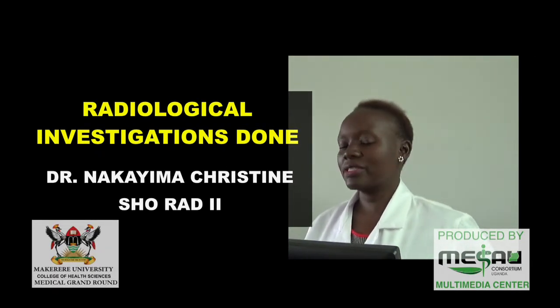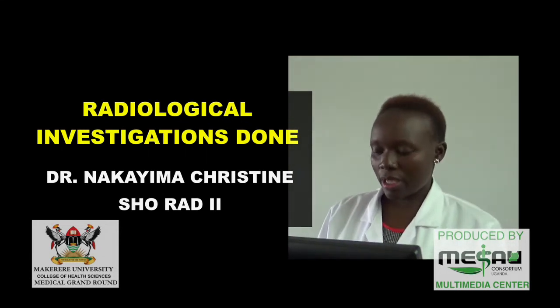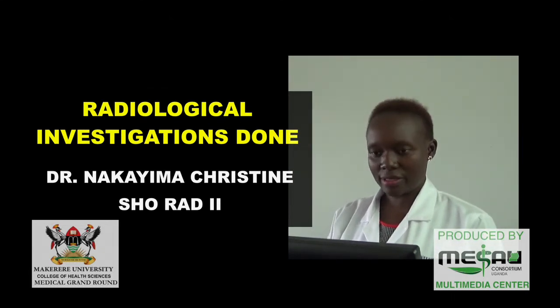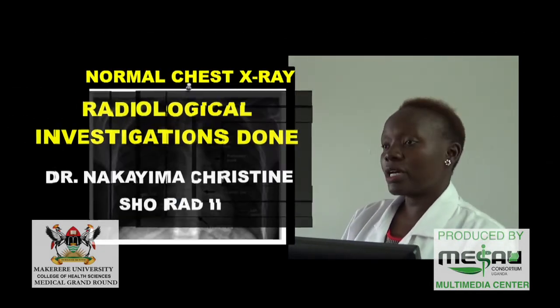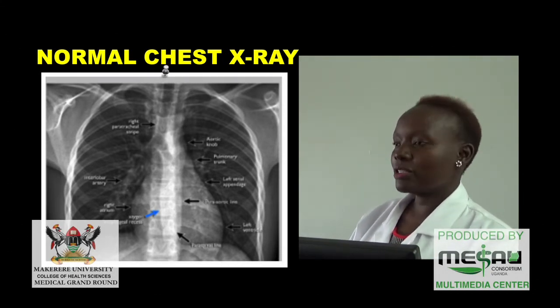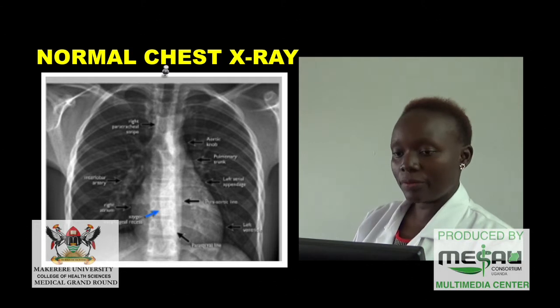Called Dr. Nakayima Christine from the Radiology department, and we're going to look at X-rays and investigations that were done with an understanding of what the patient has. So just a little bit of orientation about a normal chest X-ray. I believe we have done the gross anatomy, so this is the radiological anatomy, and those are the features that we see.